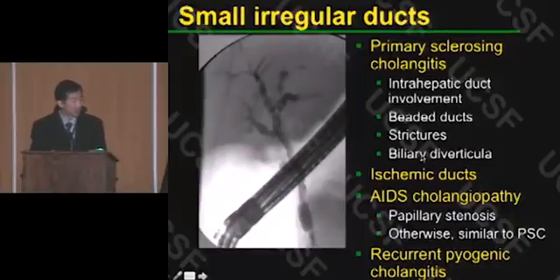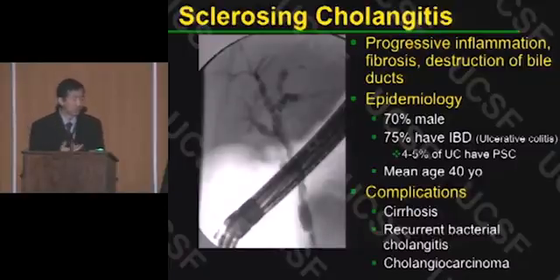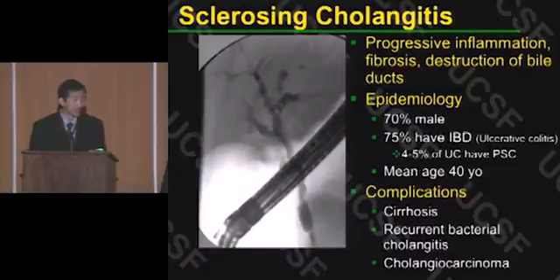And finally, some other diseases can also give this appearance, but we usually think about sclerosing cholangitis and maybe ischemic in reality. This is a progressive disease that inexorably leads to cirrhosis. It can take about 4 to 10 years to occur. It's kind of like having a slow cancer and eventual liver failure.